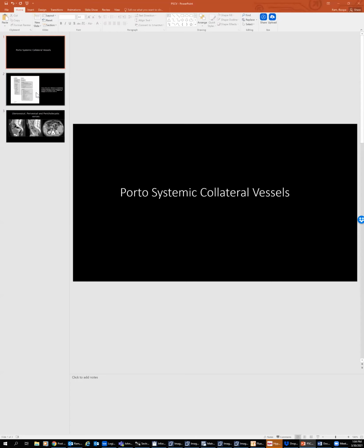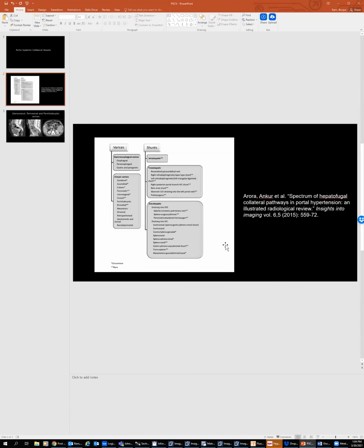So this was basically portosystemic shunting. And the reason we have to know this is that these can be unrecognized causes of encephalopathy. And for the IR guys, this is important because they need to know what approach to take in order to go ahead and embolize these. So I just pulled up a few things about this entity. We all know about portosystemic collaterals, but something we don't see is this portal to splanchnic circulation in and around the bladder.